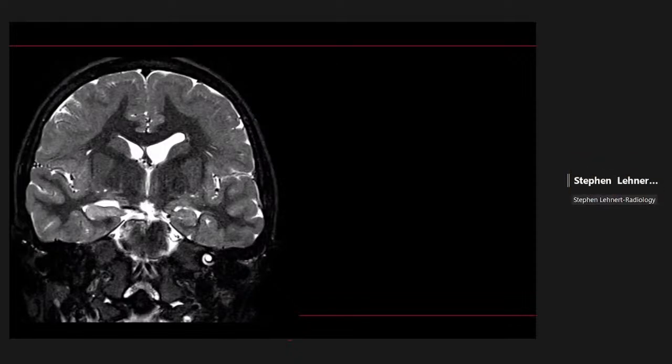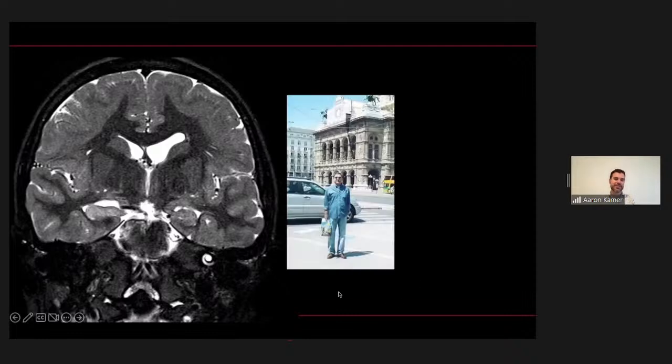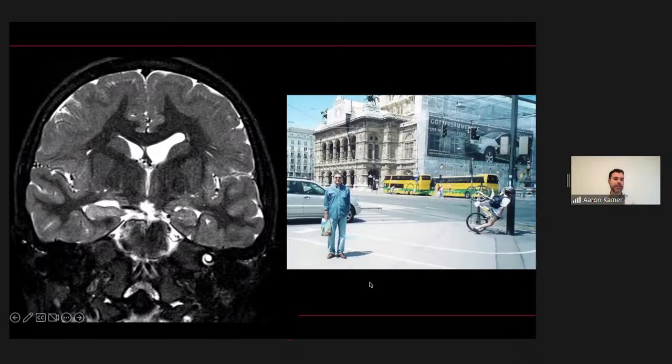It's not normal. I don't think there's quite, maybe it's just incomplete inversion of the left hippocampus. Yeah, you got it. So we've got a band heterotopia, a right mesial temporal sclerosis, and a left hippocampal malrotation, or like you said, incomplete inversion. So this is one of those cases where you think you're doing totally fine, but there's a lot going on in the background that you may not be noticing.